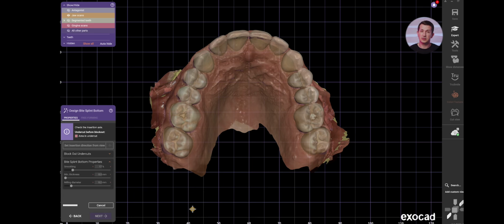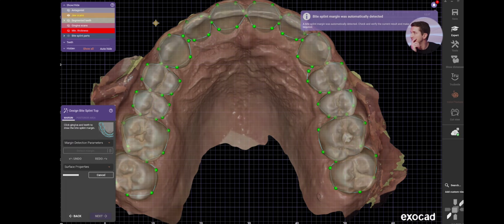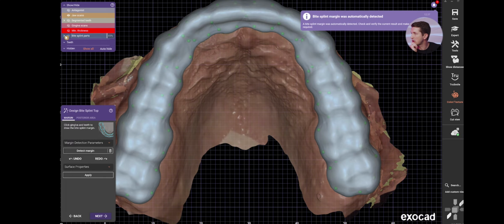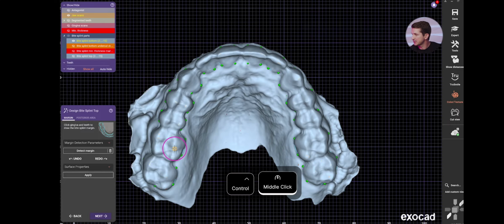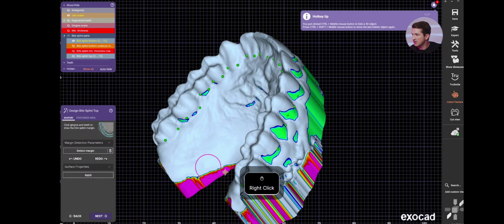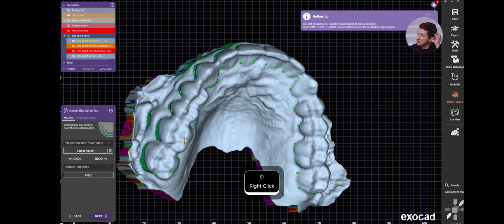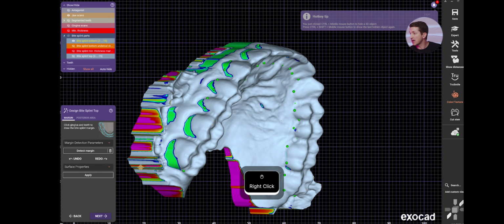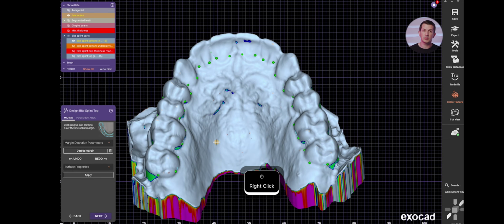It's going to generate the virtual wax up bottom, so it's going to apply the offset, the allowed undercut calculation, and the smoothing of the model. Let's just turn on the virtual wax up bottom so you guys can see. It gives us this model, where we have our blockout wax. We have a distances menu that tells us how much wax is applied here, like how much undercut is allowed or not. You can go in and adjust that, and we'll talk about reasons why we would want to do that in one of the deprogrammer cases.